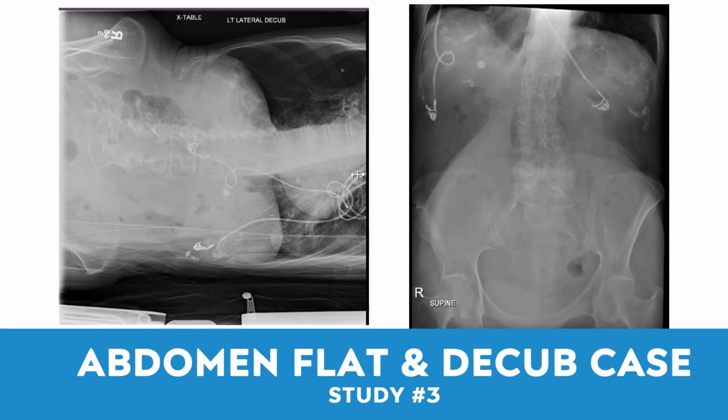Case study number 3, an abdomen flat and erect or decube was ordered, and the doctor specifically asked for a decube as well. So the patient is a 78-year-old female, history of abdomen pain. The indication is hypotension and concern for perforation. So obviously perforation calls for a decube, a little bit better than an erect abdomen.